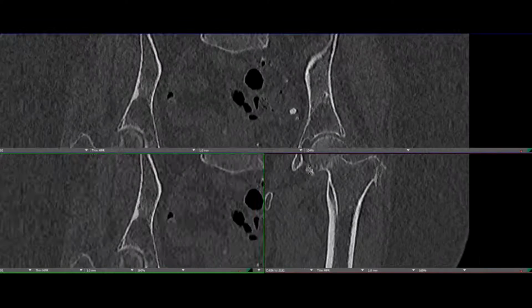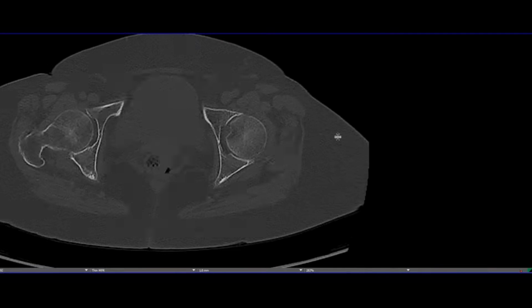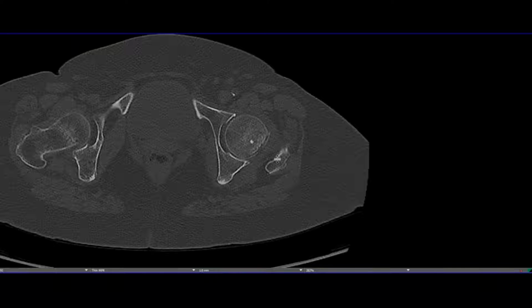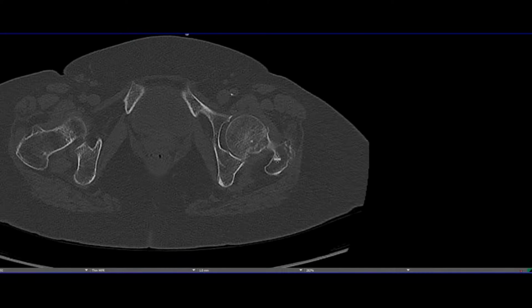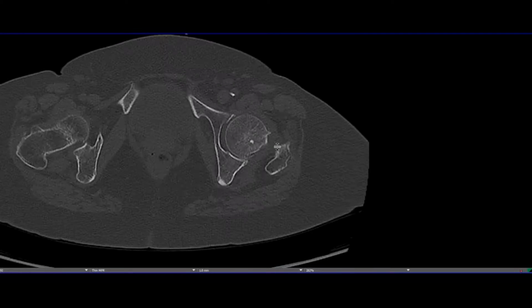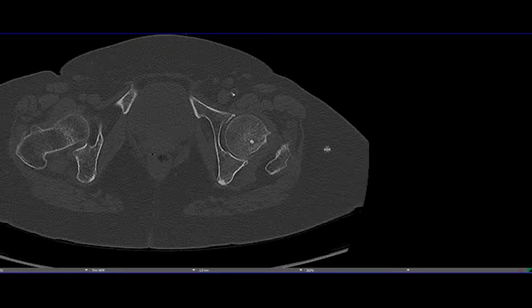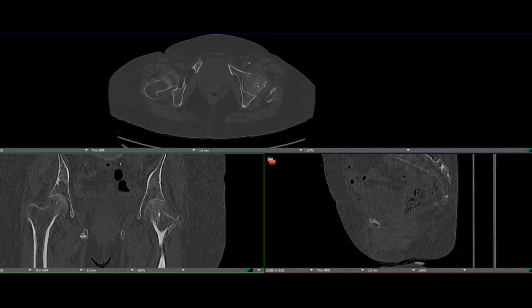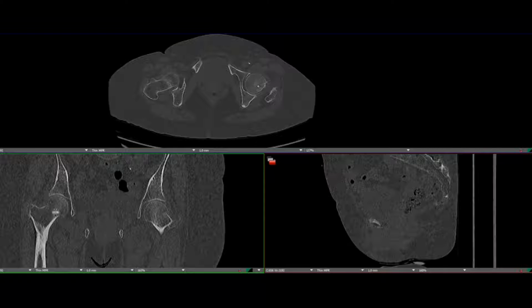So femoral neck fractures can be very easy to miss on CT, particularly if the fracture is minimally impacted and if the bones are only reviewed on the axial images. This finding can also be mistaken for degenerative changes, so comparison with the contralateral side is very helpful. So I personally check the femoral neck on the coronal reformatted images on every abdomen pelvis CT that I look at.